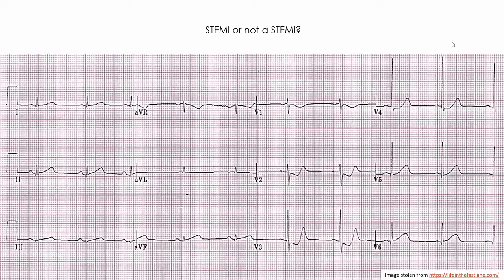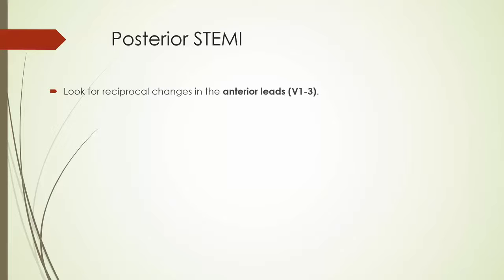Okay, so what about this example here? Is this a STEMI or not a STEMI? I'll give you a moment to think about it. Pause the recording if you need to. Alright. So this is a posterior STEMI.